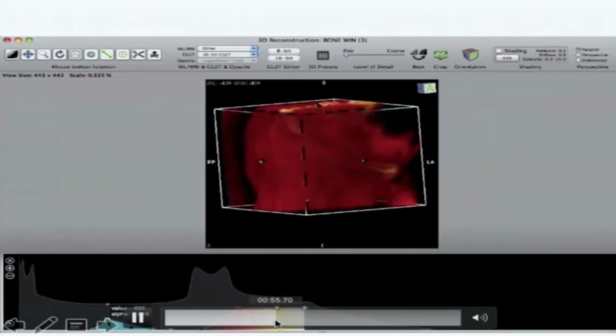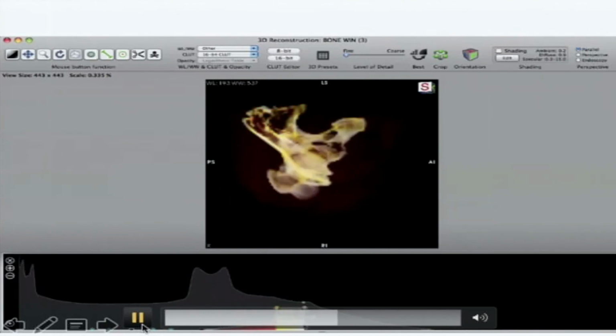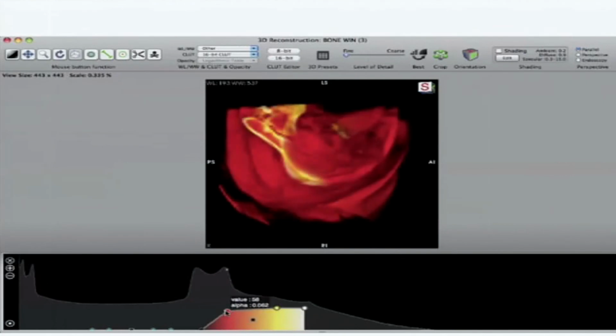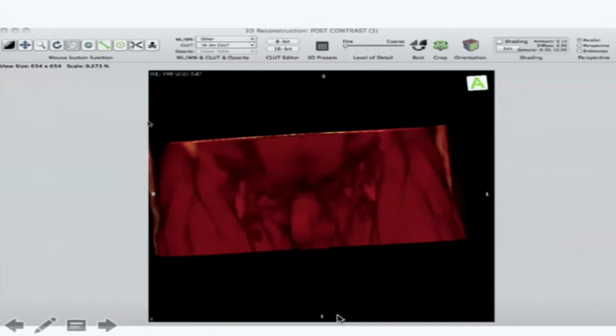In this film it is there. So I can apply a soft tissue preset, and I can adjust the value of each component. So if I increase the, sorry for that, I'm sorry, that video is not playing. I can definitely show you how it can be done.